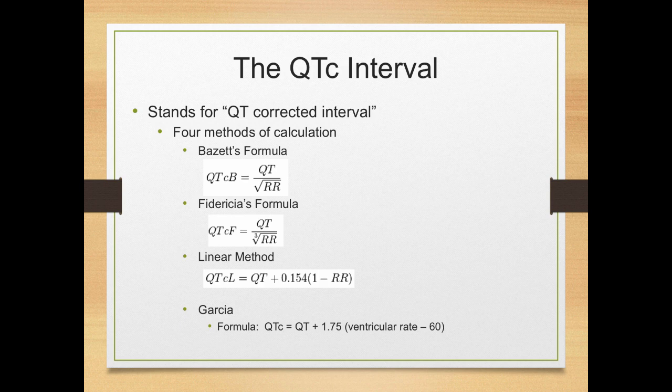But we don't actually care about the QT interval. And I know you're sitting there saying, no, I do care about the QT interval. Yeah, we do. But we care about the corrected QT interval, the QTC. And what are we correcting for? We are correcting for the heart rate.